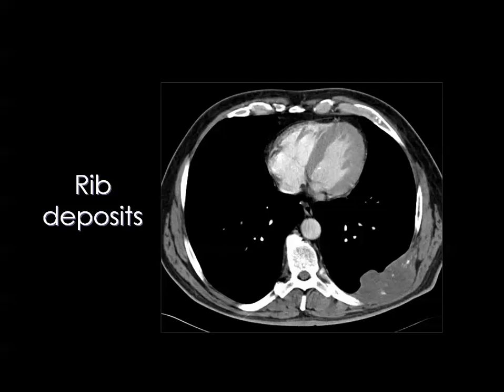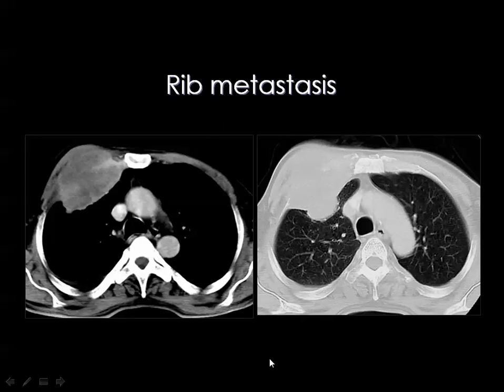Well, this is a malignant lesion, and too many possibilities may be included. You can say this is chondrosarcoma, you can say this is lymphoma, and you can say that this is metastasis. But actually, metastasis should be considered the possibility number one, to be followed by other possibilities.